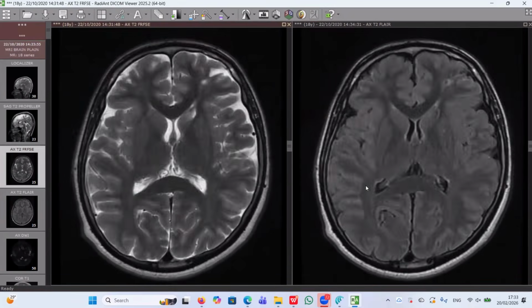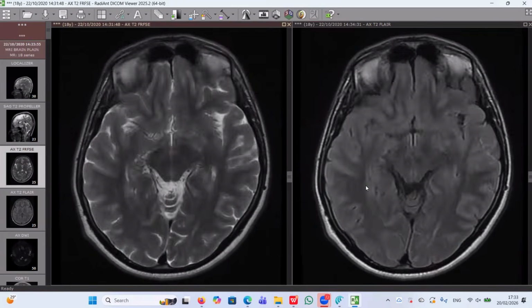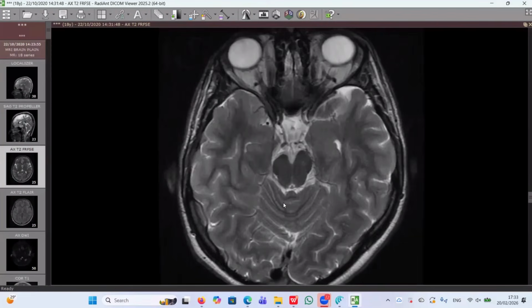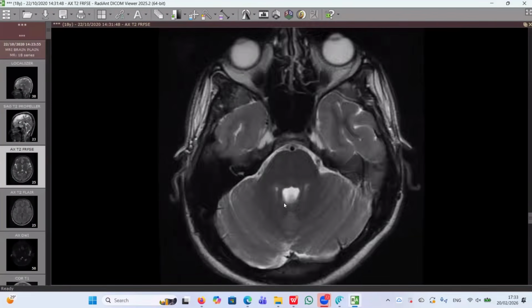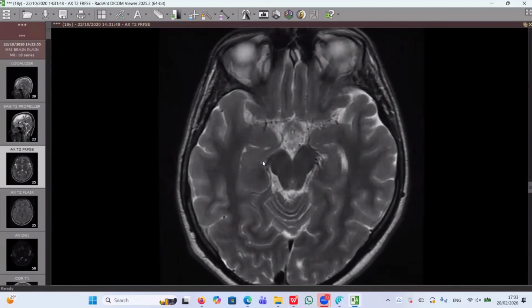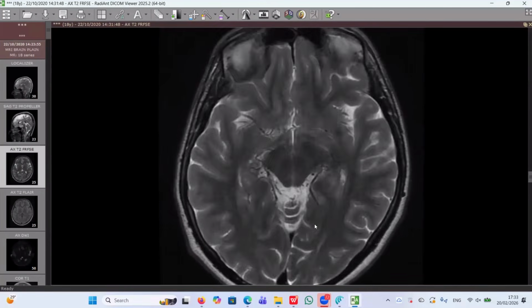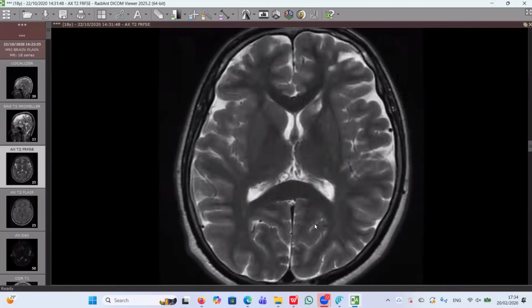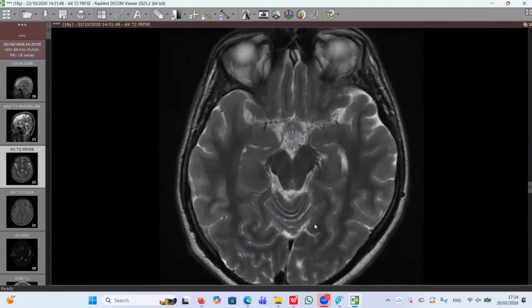There are multiple signal flow voids in the basal cistern. Okay. Perfect. You are amazing. Tell me more. What do you have here? You told me a very nice sign. You have the brain atrophied on the right side. Please concentrate again.